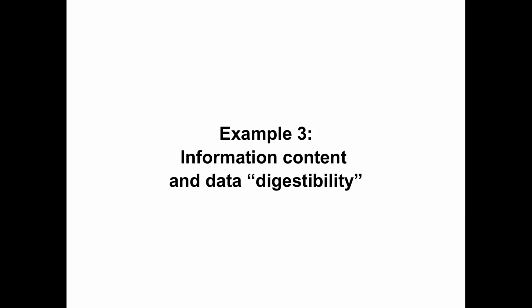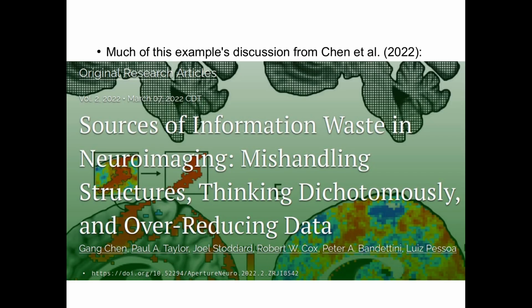Okay, now let's expand this idea a little bit, taking from these first examples of transparent thresholding maybe being better than opaque thresholding, and staying away from peak voxel statistics because those are so unstable, as we've seen. What are we doing when we report results? Well, we want to try to avoid the problem of wasting information. MRI is a really, really expensive science, and particularly if you're studying subjects that have conditions that make them difficult to scan or is very uncomfortable, that time is just really precious, let alone all the money, grant, training, and these kinds of things that go into it.